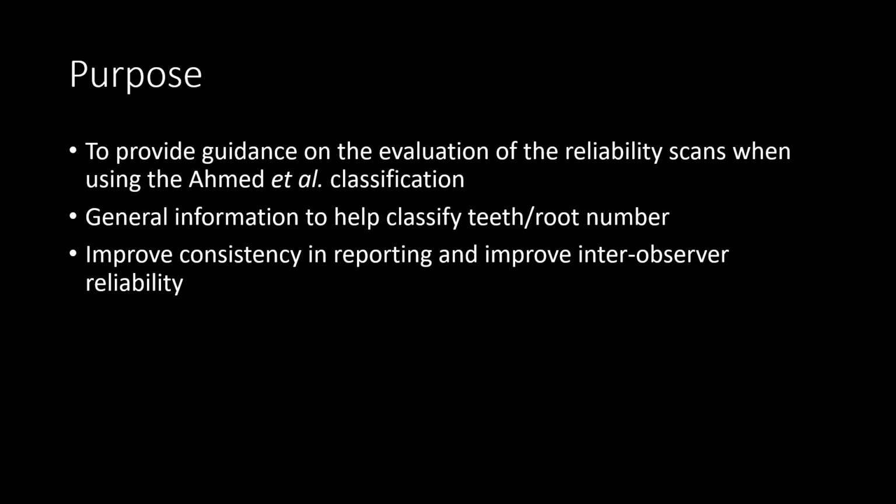So the purpose, as I said, is just to provide a little bit of guidance regarding the evaluation of the reliability scans, specifically when using the Ahmed et al. classification. I'm just going to include some general information to help classify the root number as well as the canal structures of the teeth. And the idea is we want to try to improve the consistency in our reporting and thereby improve the inter-observer reliability scores.